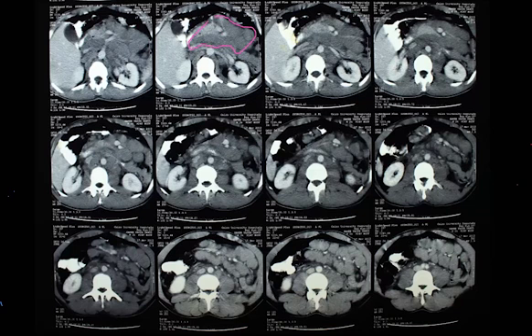You can see the nodes on either side of the aorta. You can see the nodes extending into the mesentery. You can see the nodes around the superior mesenteric. Multiple hypodense lesions, where they are all, I don't know how many they are. They seem to be discrete. They're pushing. If you go on to the image on your extreme right hand side.